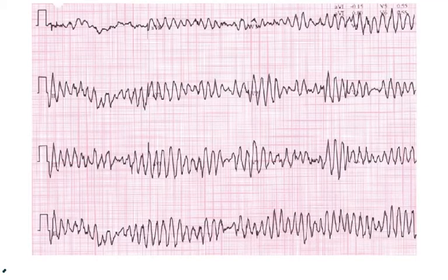In this ECG, you can appreciate that again it is tachycardia, and it is a broad complex tachycardia. The rhythm is very irregular. You cannot appreciate P waves or T waves. But if you look at these QRS complexes, initially their amplitude is higher, then they become a bit short. Again, the amplitude increases, then in between they become short.